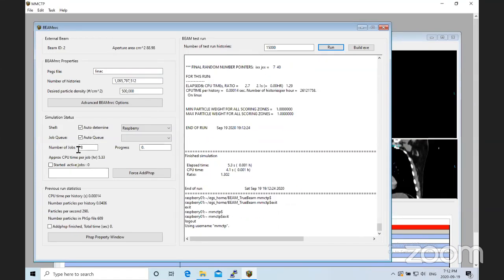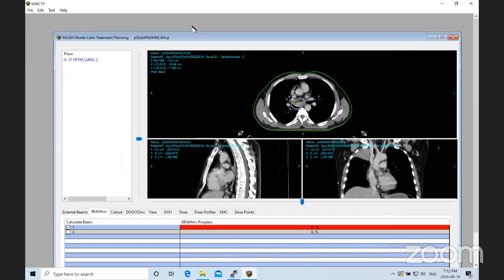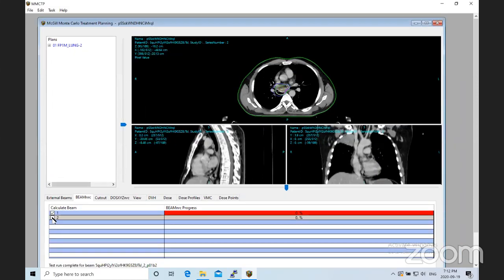Okay, let's change this to 68. It takes 37 minutes. Is that something good, Andrew? Well, it's a VMAT plan. It's a VMAT, it's an ARC. That's pretty good. Okay. Yeah.